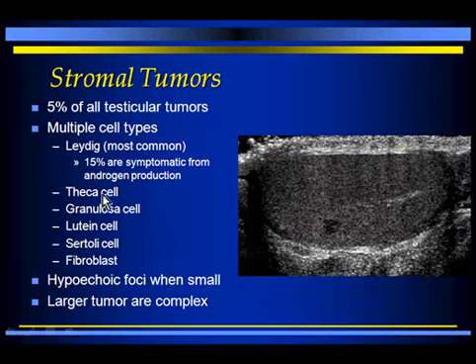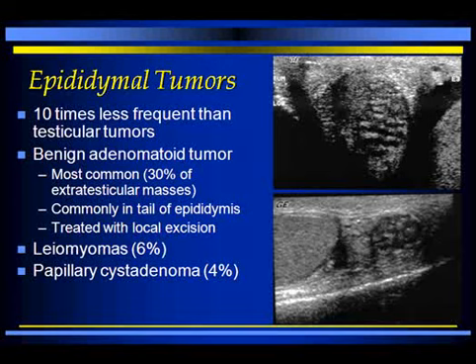So usually they're hypoechoic when they're small, just as seen here. The large tumors can be more complex in appearance, but in your differential diagnosis, you're not going to be able in general to distinguish these from seminoma.